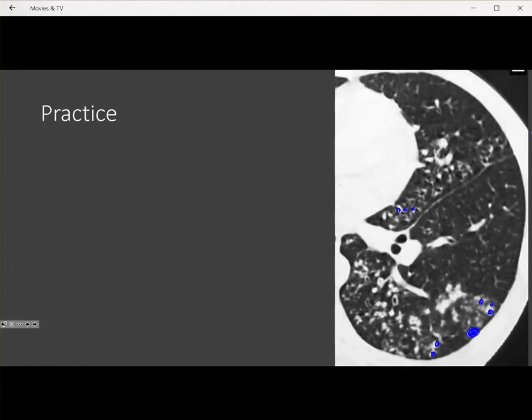When we have big nodules like this, they can occupy the whole secondary pulmonary lobule, and it can be difficult to differentiate that from either a perilymphatic nodule that's involving the edge of the secondary pulmonary lobule, or an acinar nodule. An acinar nodule being a larger size central lobular nodule that's involving a larger portion of the secondary pulmonary lobule. So let's keep looking.